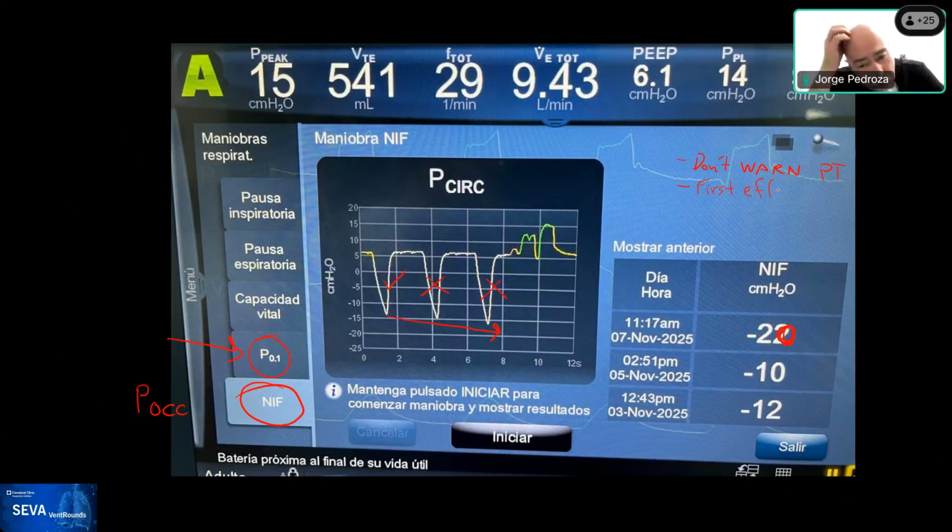It is very important because, according to our goal, what we want to do to correct the patient-ventilator interaction should be focused on the goal, and the goal in this case might be affected because the patient has high respiratory effort and high P0.1. We don't show it here, but yes, the patient has a high P0.1. So that's what will make us choose the best mode.